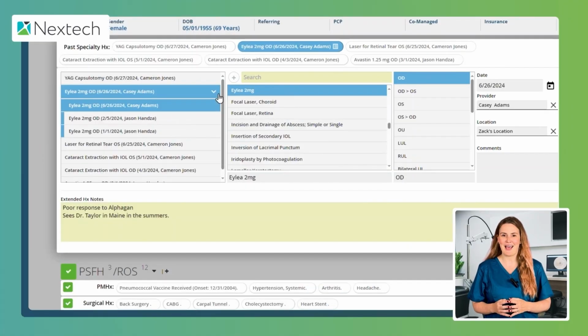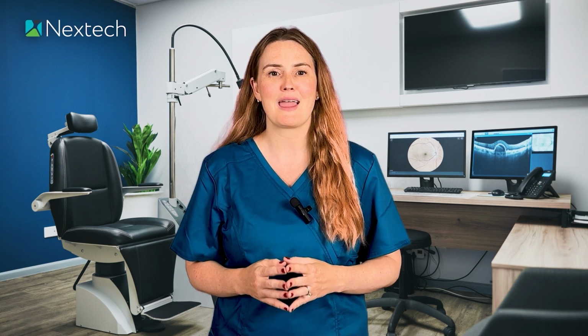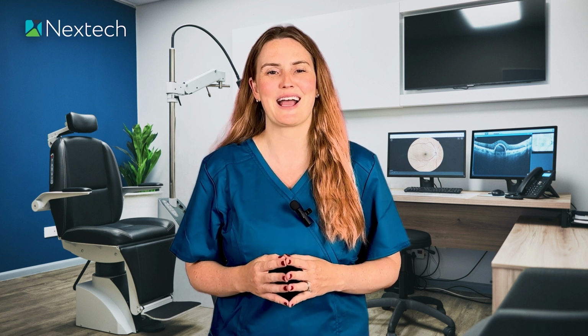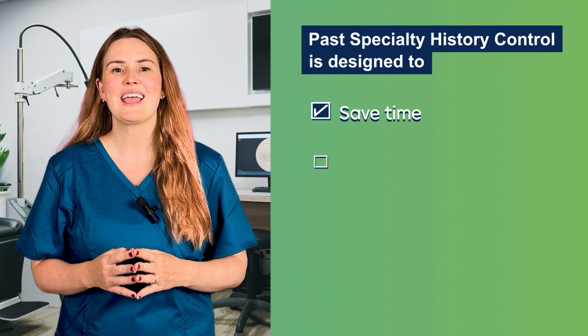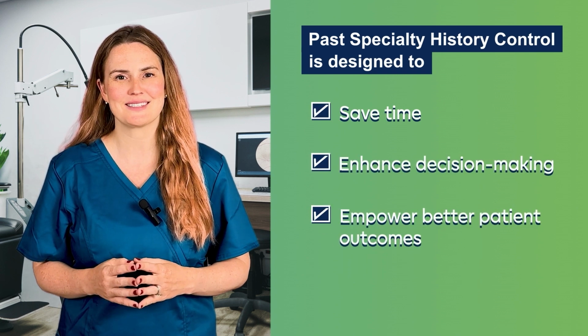You can now have access to your patient's full past specialty history within the chart. You no longer need to search old records or switch screens. Ophthalmologists who tested this feature in our early adopter program found it helped them make more informed decisions, resulting in improved patient outcomes. Whether you're performing injections or specialty procedures, the past specialty history control is designed to save time, enhance decision-making, and empower better patient outcomes.